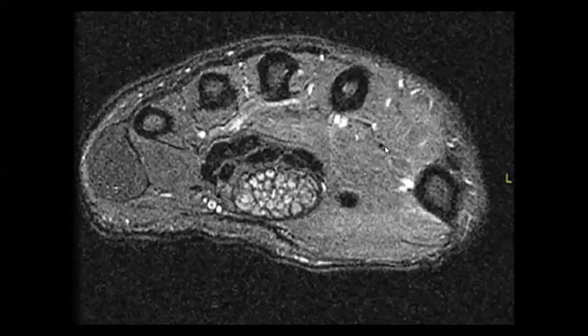And let's end with this one, which is a bit tricky. Okay, so what happened here? This one should be the nerve, which is passing here in the wrist. So what it could be?